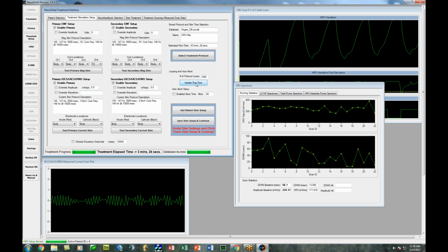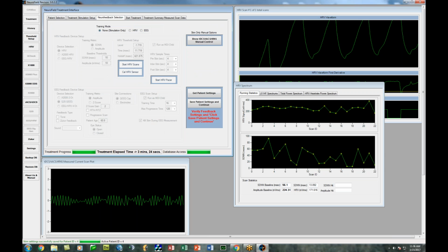Let's make it 1,000 loops. 83 minutes, too much. 500 loops. So that's 41 minutes. I could set an abort time to 45 minutes so it doesn't go longer than that. Once it's set, I save and continue.